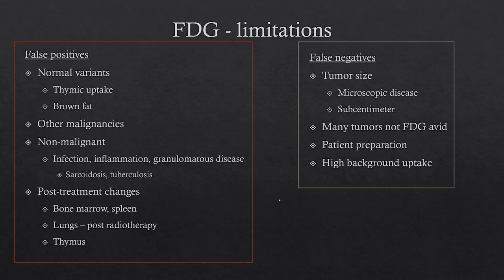thymic rebound. Now, false negatives: some tumors are not avid for FDG. Some tumors may be very small, sub-centimeter, and you may not be able to see the FDG uptake they have, if any. This can often be seen in lung nodules.